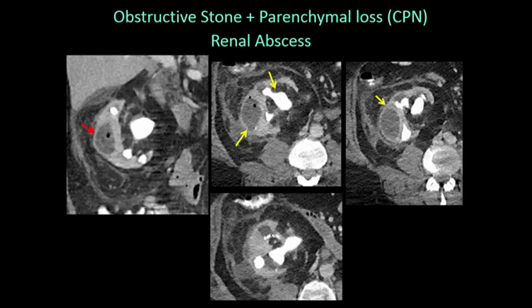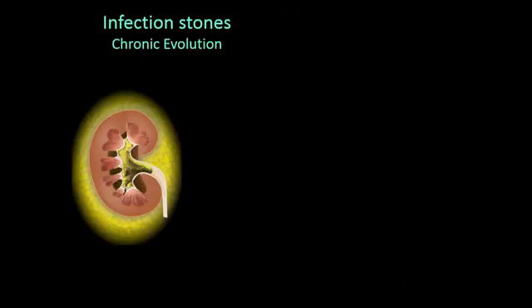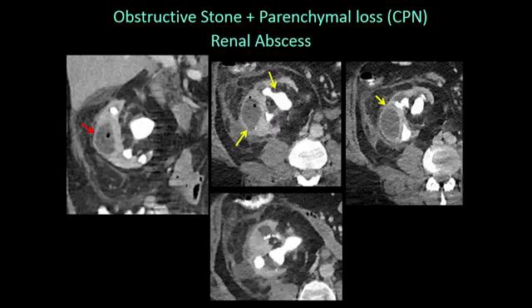We've all seen these patients. They've had these large stones. The stones are not moved in a good time, and they form collections within the parenchyma. You have a renal abscess. There's already perirenal infiltration. This is a problem for this kidney, and many of these have to go on for surgical excision. So that's the acute phases of the struvite stones with infection.